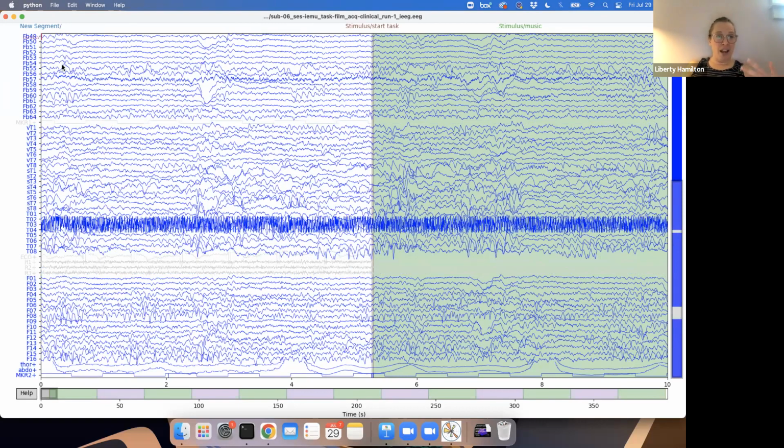And that's also why that power spectrum looks so funny when you plot it: you're plotting a lot of things that are not brain activity. So overall, I think using those types of readers is very helpful, and so storing the data like that is helpful.